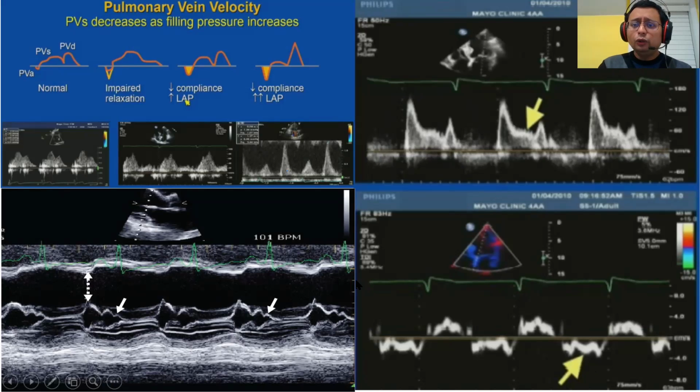One favorite question in the echocardiogram boards is this thing called a B bump. What is a B bump? This is mitral valve opening. You can see that this is D point, E point, F point, A point, and C point. However, you can see that from A to C here, there is a bump, like a shoulder there. This arrow there is also very specific for increased left atrial pressure. We call that the B bump.